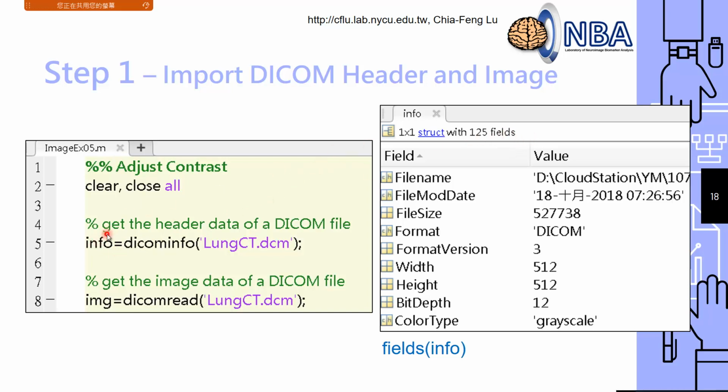So anyway, the very first step, just key in these 3 lines. Again, you can skip the notation right here. Just put these 3 lines, the 2nd line, 5th line, and the 8th line. Try to create a new script. Please do not use the command window. Create a new script. Again, you should name it with your student number with a prefix like G or S, right?